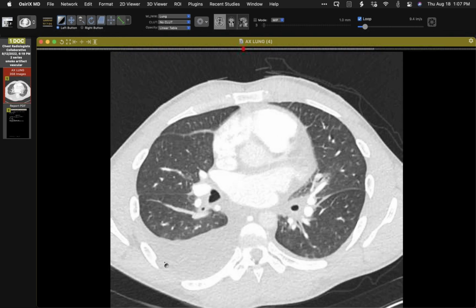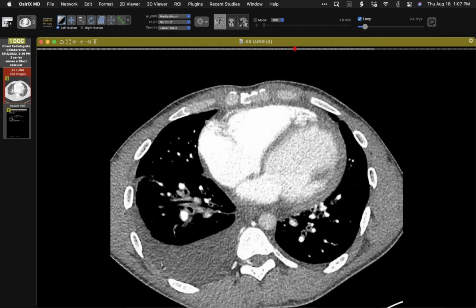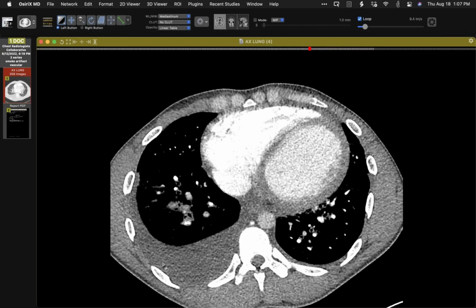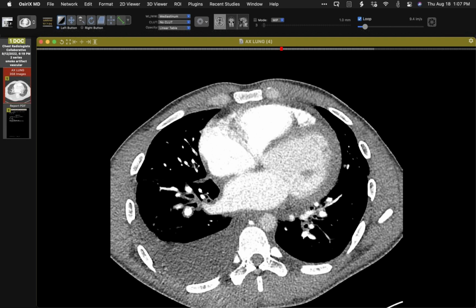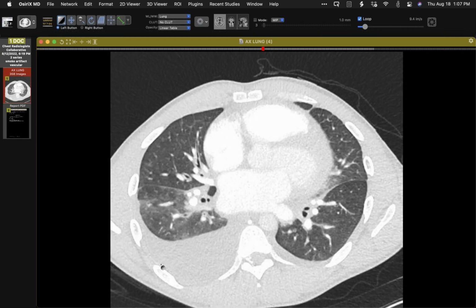Pleural effusions, right slightly bigger than left, and indeed the left ventricular chamber is particularly enlarged, and poor contractility of it and ejection fraction was subsequently shown to be low on cardiac ultrasound. So we have hydrostatic lung edema.